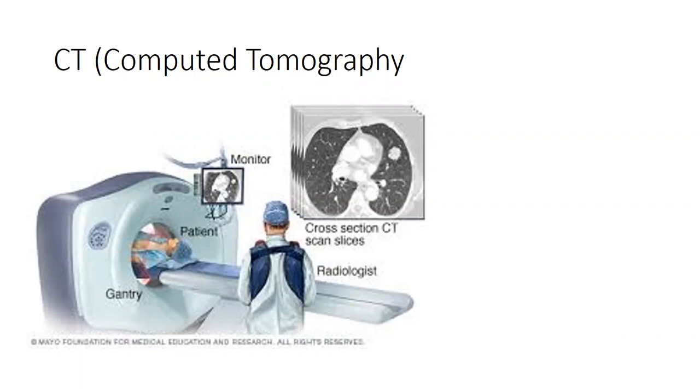All right. So what part of the body are we looking at there? That's the heart. Does it look like the heart's beating? Do you have a lot of motion degradation? Not really, right? How fast does the heart beat? 60 to 100 beats per minute, right? So it's a lot faster than that in terms of the image acquisition.